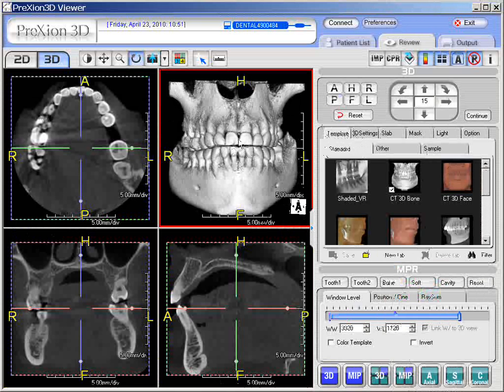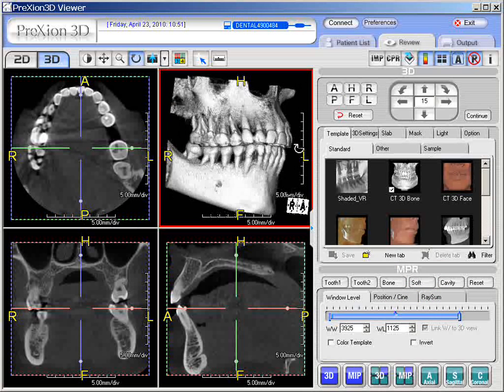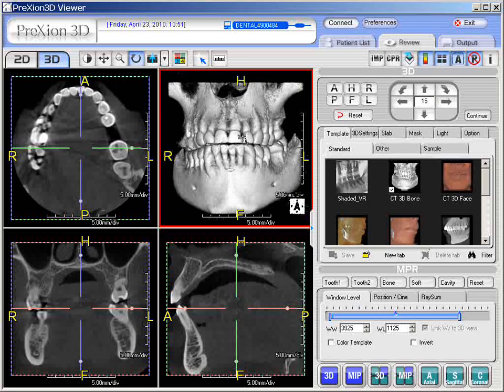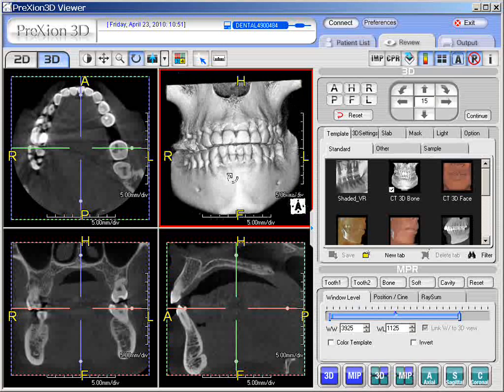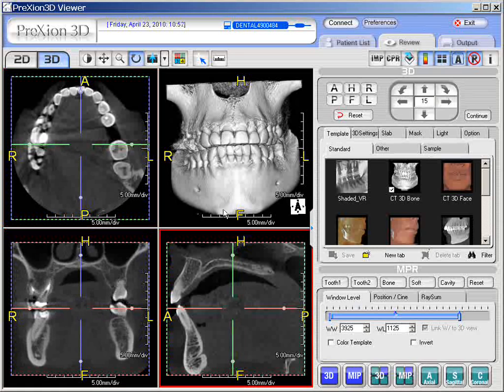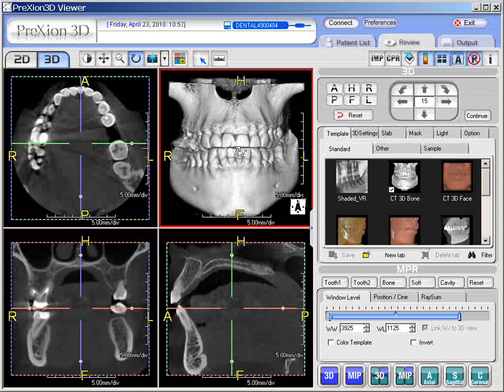One last but important note on the 3D image. Remember, it's an overall global view of your dentition. Although very nicely, you can see the areas that you need with one image. Be very careful when you window level that you don't under or overestimate the amount of bony loss. Okay. Remember, your better sensitivity for that is your multiple thin slices with your CT images here, axial, coronal, and sagittal. Okay, so just always check your bony density against the level of the CT images, and that will be a good idea to do that, so one doesn't get too dependent on the 3D.